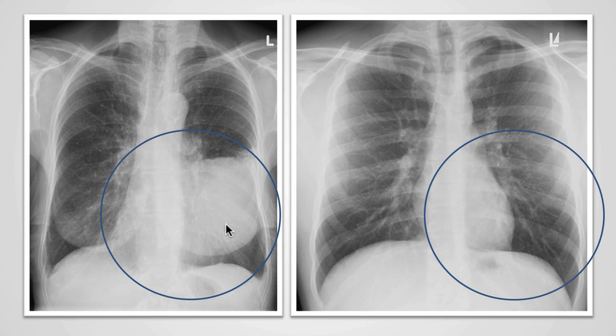And this is because this patient has a pneumonia. The pneumonia is soft tissue density and lies adjacent to the heart. Because of the silhouette sign, we only see one structure in this region, and this is this white area, which is the sum of the pneumonia and the heart border.